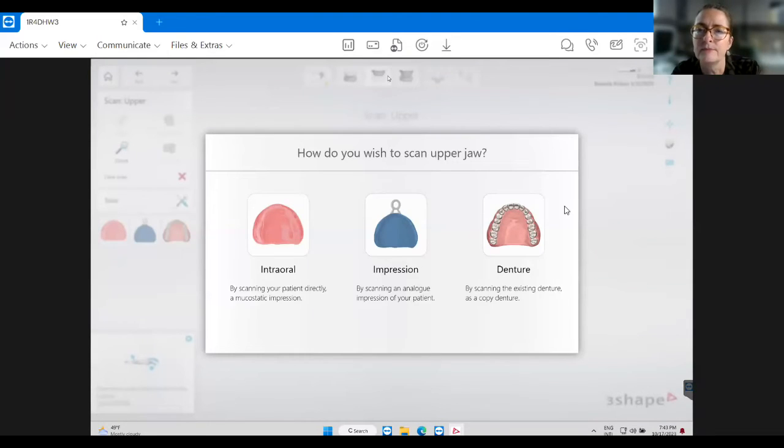Okay. Yes. And another thing, before you put a wash, heavy body, light body in your denture, I would put a little adhesive because you don't want it to flop around. On this one, when I'm scanning, you'll see that there's a void. Make sure there's no voids. You want it to be almost like if you were to do a reline on that denture.